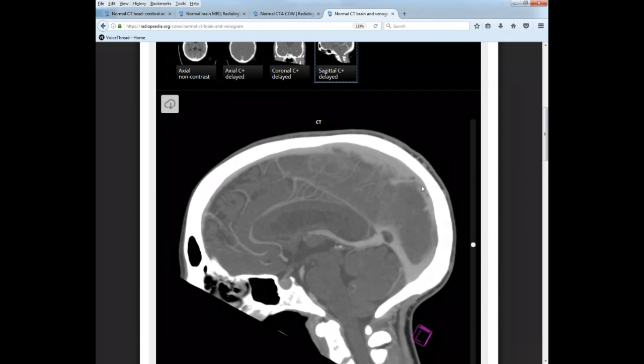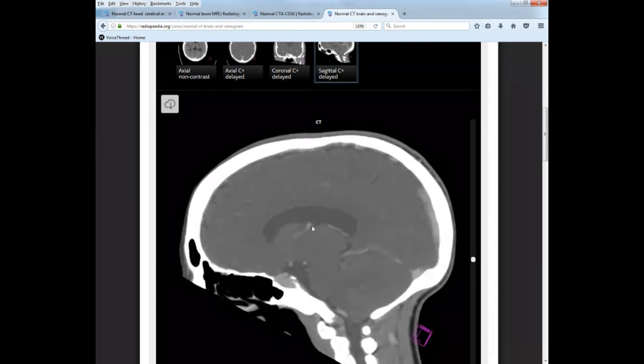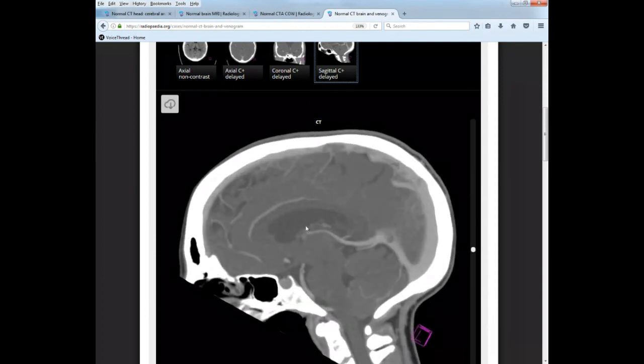Superior sagittal sinus comes down. Back here, I have this guy right here. This is your straight sinus. There's your straight sinus. It's pretty good size. This little segment here is the draining of all these internal veins, the internal cerebral veins. All of these other little veins are going to come down and form the great vein of Galen, this short little segment right here just before it empties into the straight sinus.